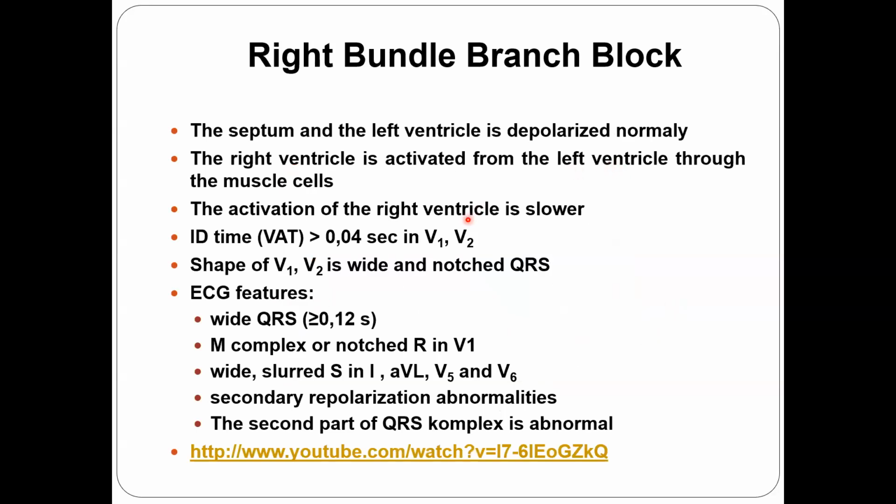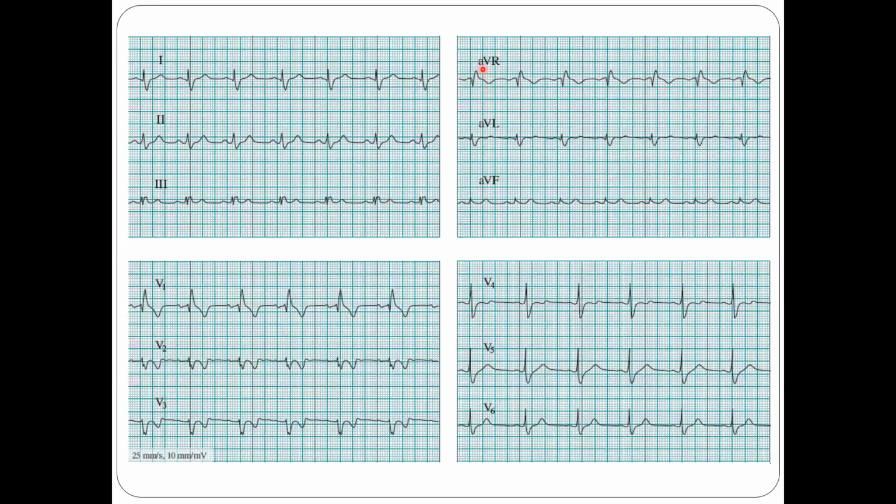Okay. I don't want to talk too much about the very simple one, and you can diagnose it by looking at, for example, V1, or looking at the left side, lead 1 or V6. You do see that very slurred and wide S wave on the left side and a tall R wave in V1, for example.